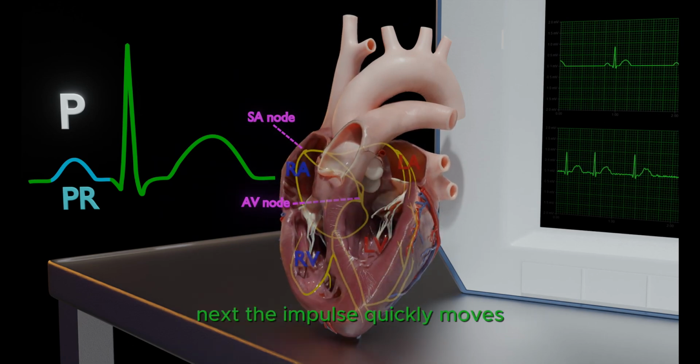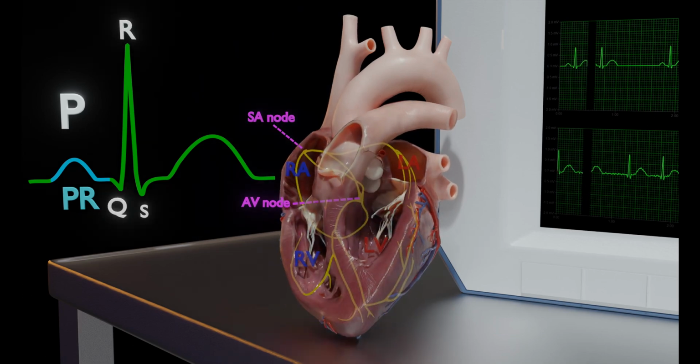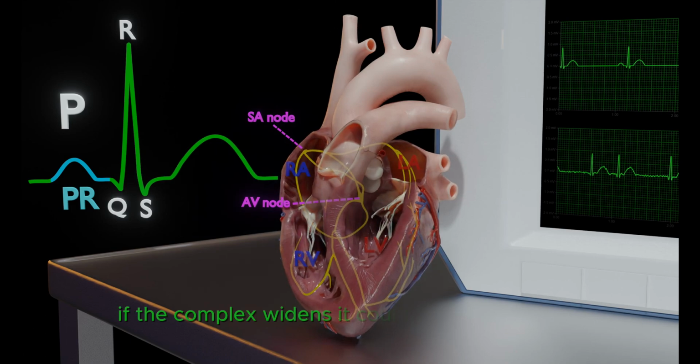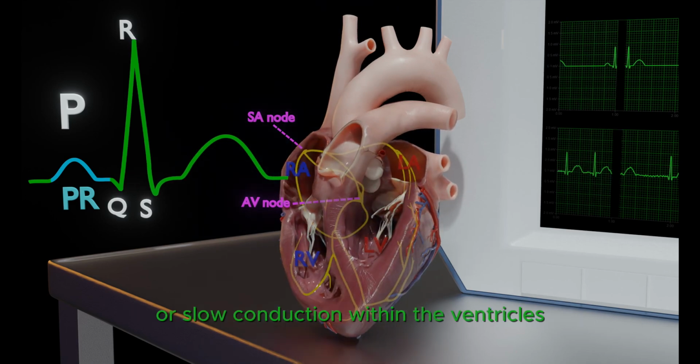Next, the impulse quickly moves into the ventricles, causing them to contract. This rapid, powerful event is represented by the dramatic spike called the QRS complex. Remember the mnemonic? QRS stands for Quick Rapid Squeeze, and it happens in just 0.06 to 0.1 seconds. If the complex widens, it could mean a blockage or slow conduction within the ventricles.